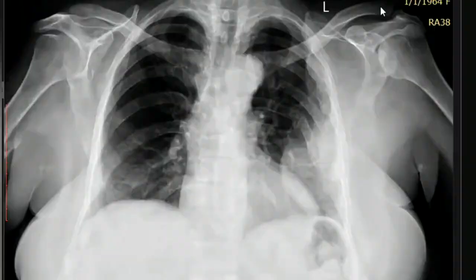Provided is an X-ray chest frontal projection in an adult female patient, which shows a well-defined rounded peripherally placed opacity in the left lower hemithorax. This opacity has a smooth inner margin and a broad base with the pleural surface.